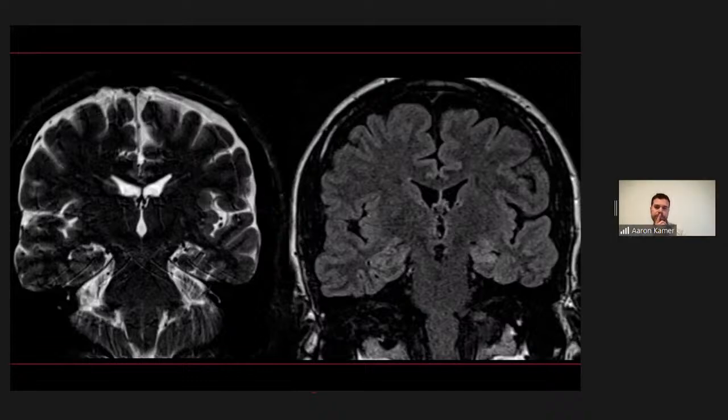So we're mostly focusing on, I mean, these are designed for the hippocampal cuts. So the biggest thing I see is bilateral abnormal signal. Looks like maybe slightly brighter on the left. And then there's also maybe some bilateral architectural distortion, honestly, on the right.